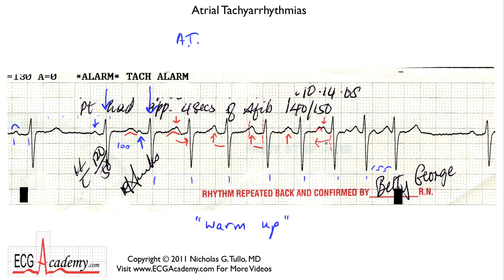And you'll say, come on, are you sure about that? And I'll say, well, look at the next one. Now you still see two bumps, but they're much further apart. Which one has moved? Which one looks like it's associated with the QRS? You figure, well, I think that's the P wave, because that's closer to the QRS. But it turns out that this is the P. Now, how can you say that? How do you know that? Well, it wasn't here, and it's unlikely that the T wave moved because the QT interval cannot suddenly shorten.